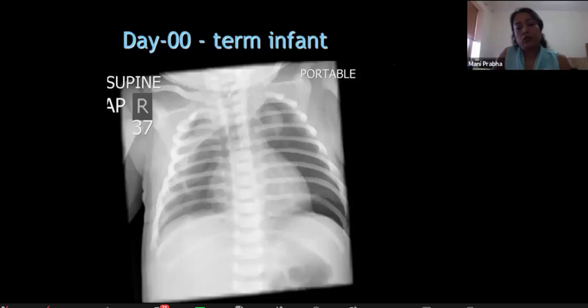Okay, let me take over. And see, there is more lucency on the right side, which is projecting up to here, isn't it? And there is an opacity here, which is the left lobe of thymus. This is the right lobe of thymus. And why is the mediastinum not shifted in this one? Because the pleura actually goes on to the other side, and the air is only in the pleura. So this is a case of pneumothorax.